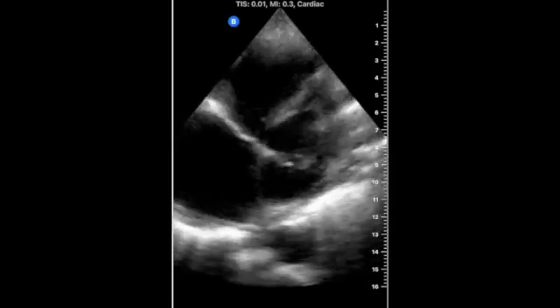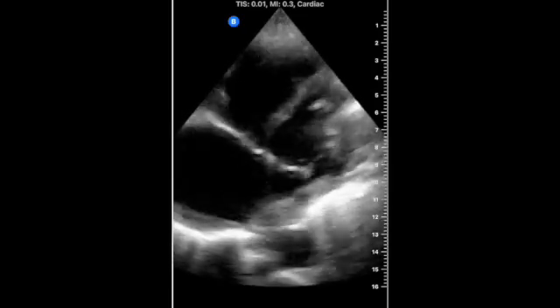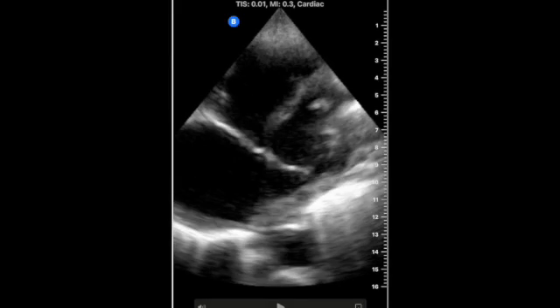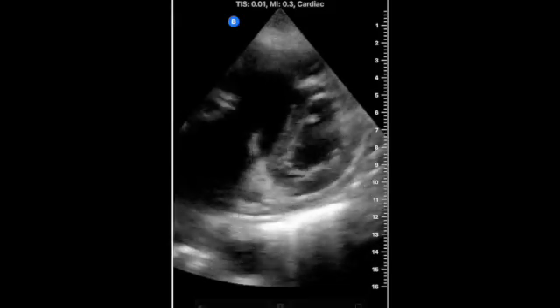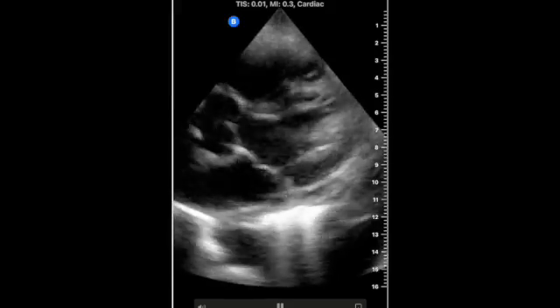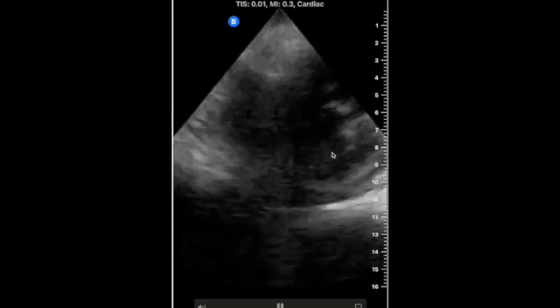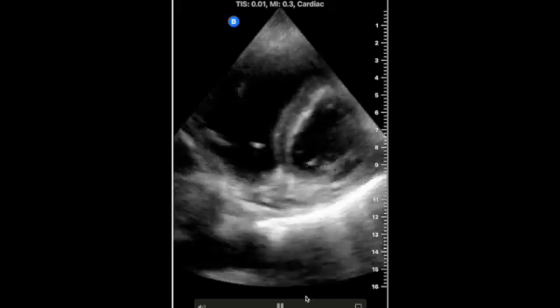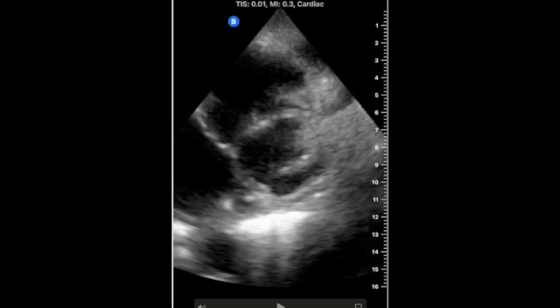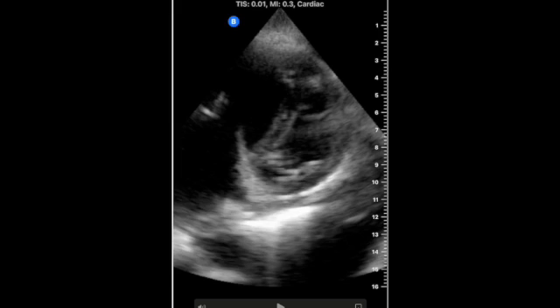But as you can see, this is a cardiac ultrasound. It could be a subxiphoid view. It could also be a parasternal view. But let's go over what we see here. First, let's identify some landmarks. So let's go back there. I'm going to push pause for a minute. See if I can get back there. Okay, a few landmarks. Okay, that seems pretty good.